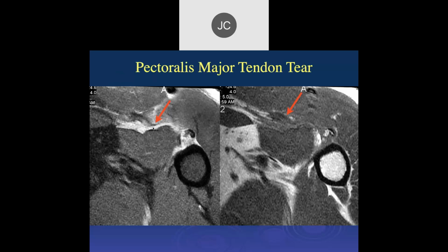And so the question, the reason we do these, is this surgical or non-surgical? This is surgical because only the tendon is involved. Good. So it looks like the tendon is torn off the bone, and that's a fixable lesion. If the tear has anything to do with the muscle, then you can't really sew it very much, and it's not really a surgical lesion. Good.